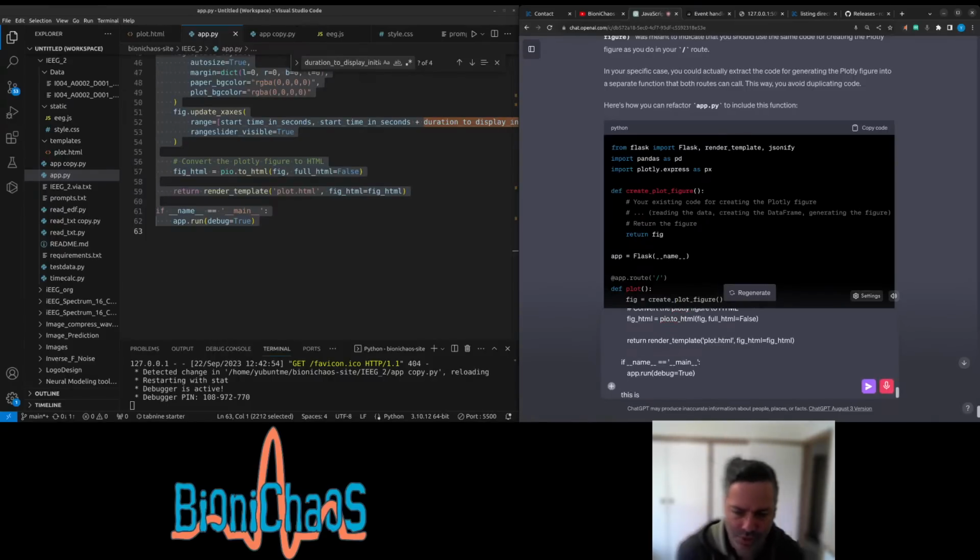This is the original Python code. What changes do we need to make to use a JSON to load the data into HTML?